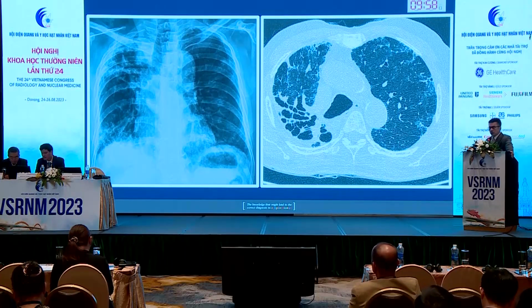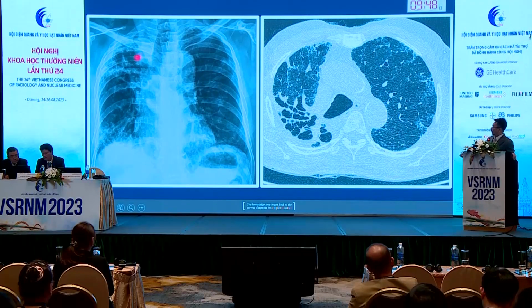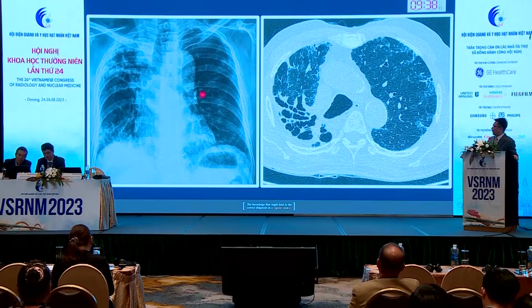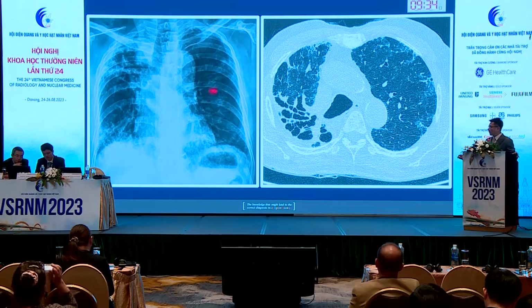Tuberculosis tends to repeat the findings. I think all of us are very familiar with tuberculosis on chest X-ray. For example, this patient, an 80-year-old, has a chronic infiltration in the upper lobe, and the right lung seems smaller than the left lung. So in the chest conference, all the radiologists and chest medicine doctors thought of tuberculosis because of the typical chest X-ray.